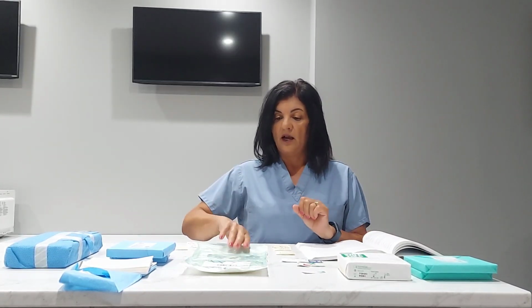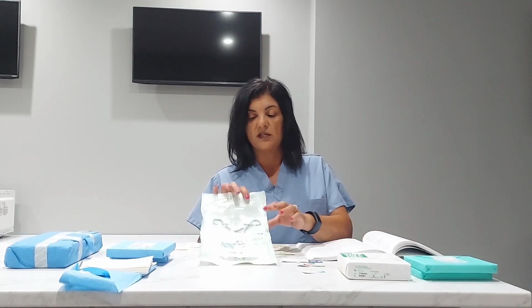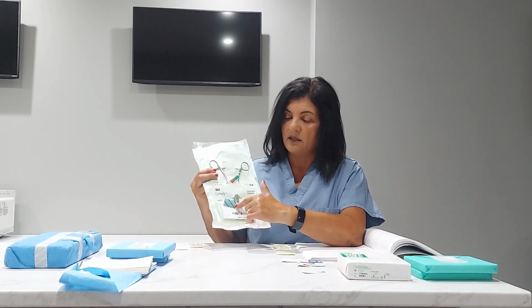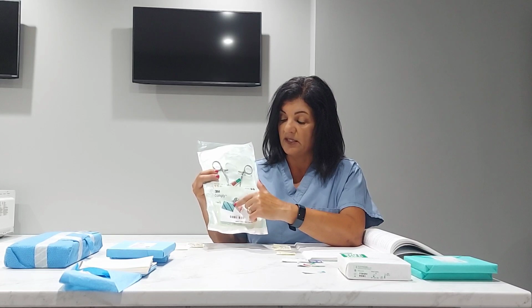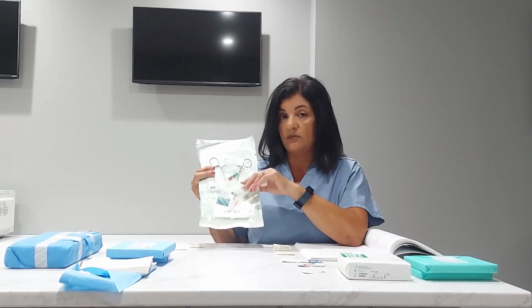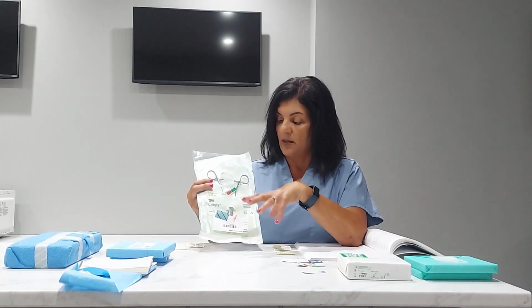So I have an example here of a peel pack that has been sterilized. Just to give you an example, my first visual is that this tape has been exposed to one of the 3 parameters because these lines were cream colored and they are now black. So that tells me that this package has at the very least been exposed to heat or temperature.